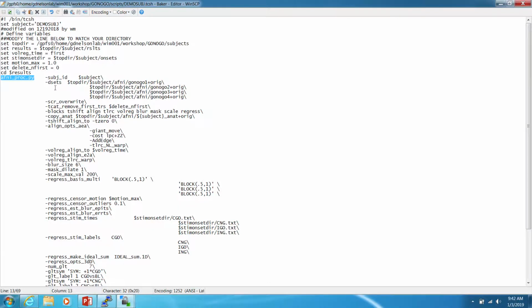So basically, when you have a new study and you're about to start this, it's really important that you get everything set up in a directory structure, and you set it up exactly the same way in every person, and then you go into a template like this and change the little things. This is my top directory. It's called this. This is where the data are. And so you go in with this template and make a few adjustments, and then you're not starting from scratch.